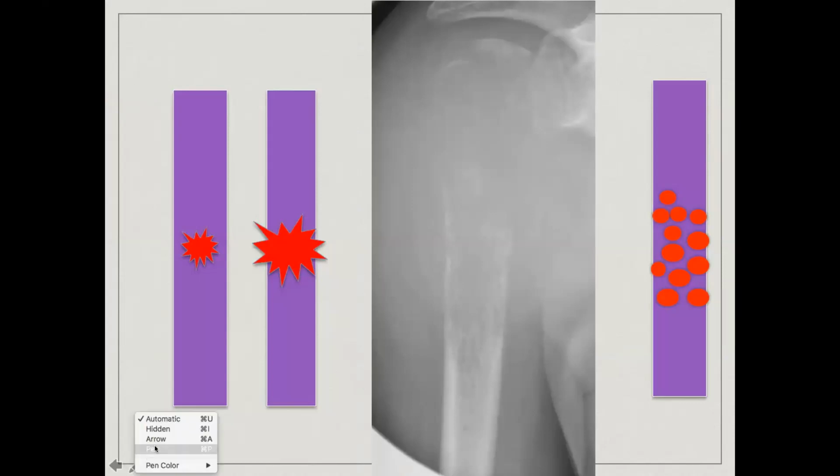So if you look at this lesion, you can see definitely first step identification has been done. But you are not sure till what level the lesion is going. You can only see this, but the lesion is all over here, and you really don't understand till what level the lesion is going over here, right?